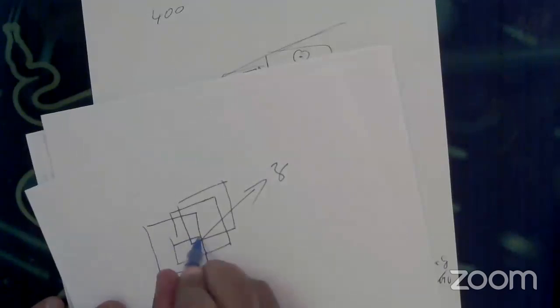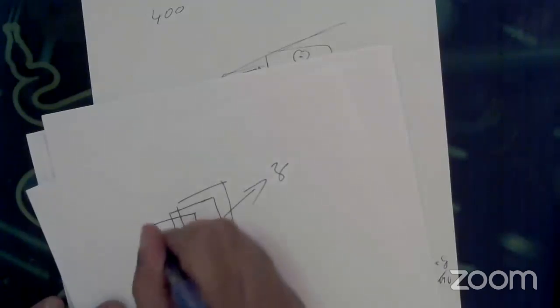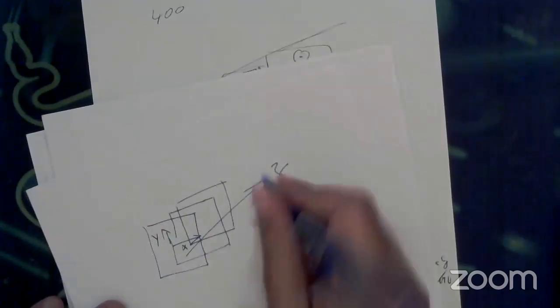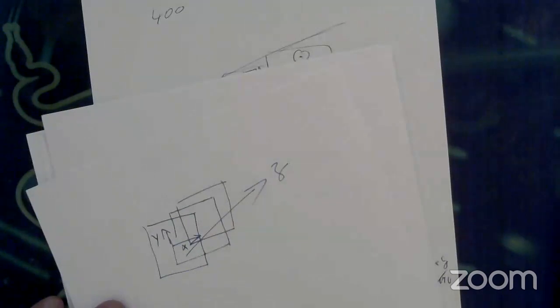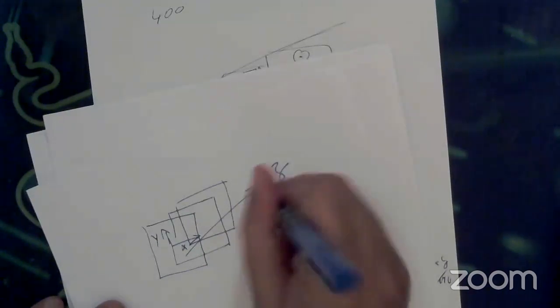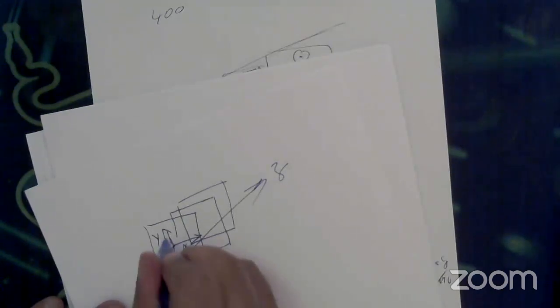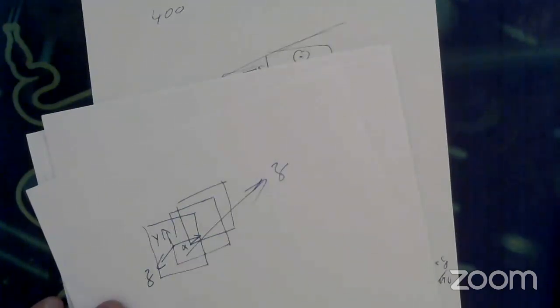And within a slice, this is actually the X-axis, and this is the Y-axis. Okay, so the Z-axis, because we need to use the right-hand rule, the Z coordinate is actually going to be like this. Okay, because X cross Y should give me Z. That's how it is.